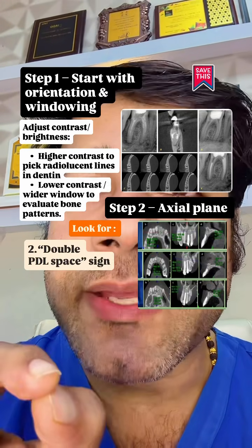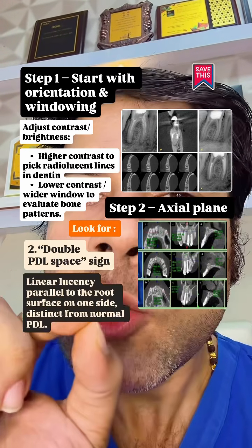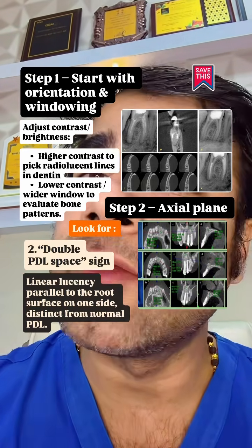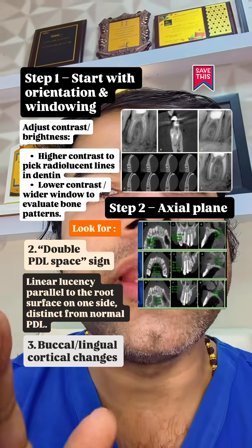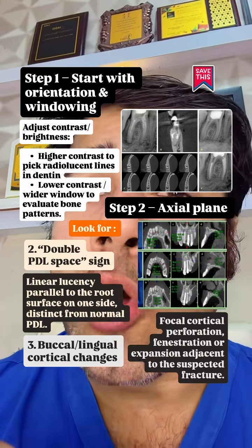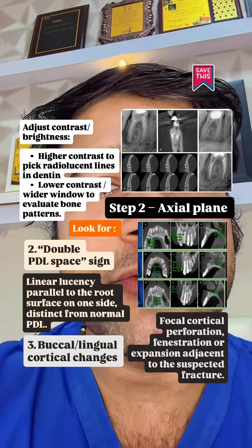Double PDL space sign. Linear lucency parallel to the root surface on one side, distinct from the normal PDL. Buccal or lingual cortical changes. Focal cortical perforation, fenestration or expansion adjacent to the suspected fracture.